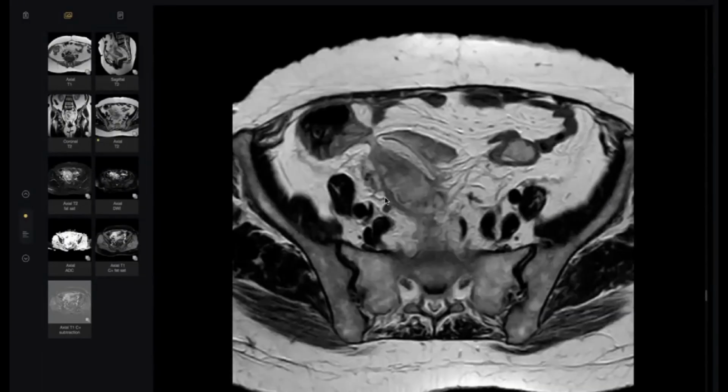Anyway, if you told the examiner this is tubo-ovarian abscess versus more likely appendicitis, he will be very happy. Why? The message is that you are on the correct pathway of a surgical decision, of an emergency. Why is this an emergency, doctor, in your opinion?